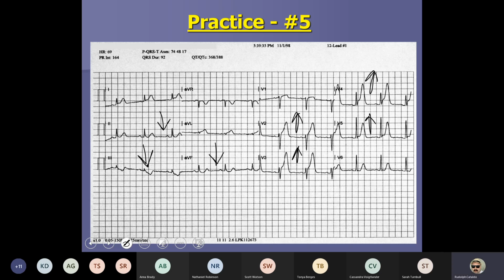Okay. Axis deviation. Tell me what it is. Both thumbs are gonna be up. Okay. So I can't remember what that one is. Good axis. Normal. Good axis. Okay, so that's normal then.